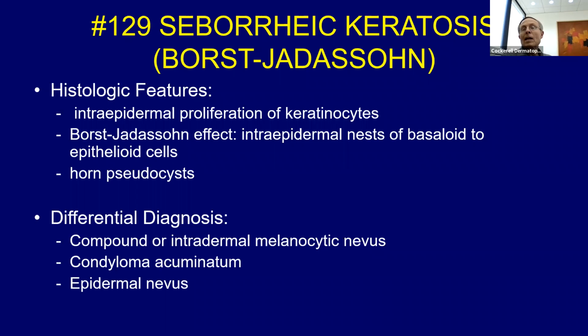Maybe it could look like a condyloma. I probably wouldn't think of that too much here, but it's just another example of an interesting lesion that's got an unusual histologic finding that can sometimes simulate a malignancy.